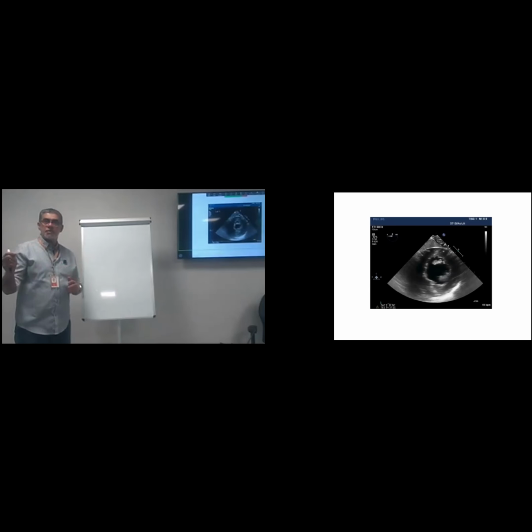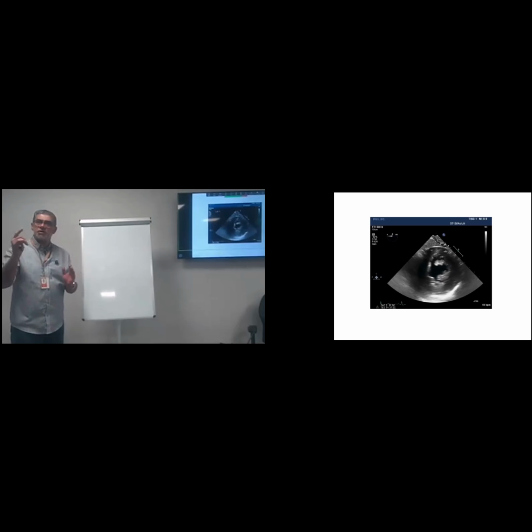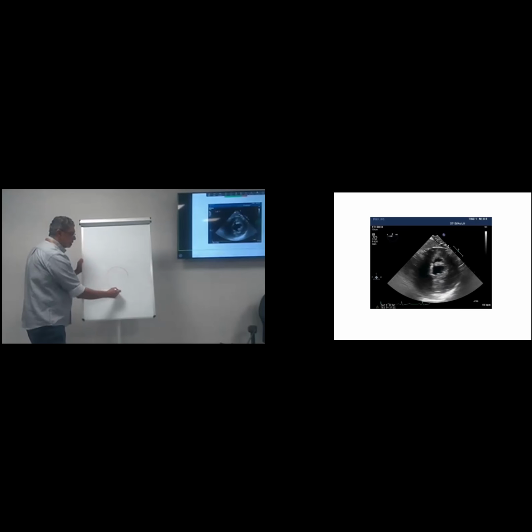The problem in the lecture, one thing, is the names of the walls. You are always confused with this. We solved one area, but we didn't solve the next area. We solved this first area. Now, inshallah, you all know this is inferior, this is inferior, this is anterior, and we divided it into 3 parts.